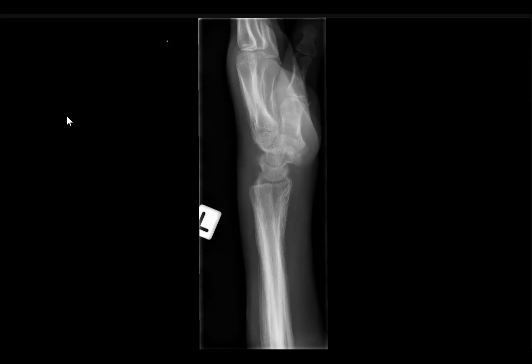This is the lateral wrist radiograph, in which I can appreciate that there is a periostitis, a periosteal reaction, and there are shaggy boundaries of the radius seen. Actually, it is also the same finding seen in the ulna as well. It is looking like periostitis. There are no intrinsic bone derangements, and the radius, carpal bones and scaphoid are in line.